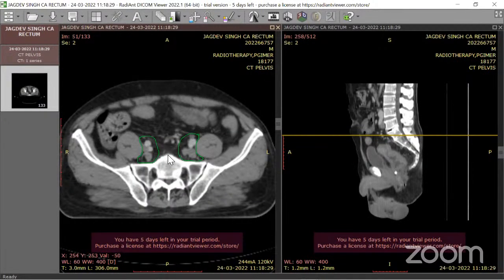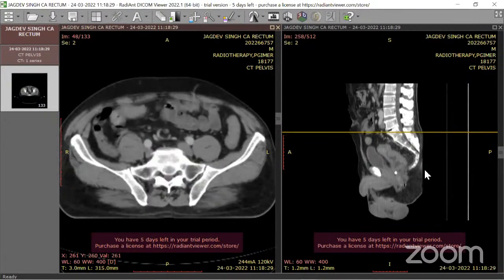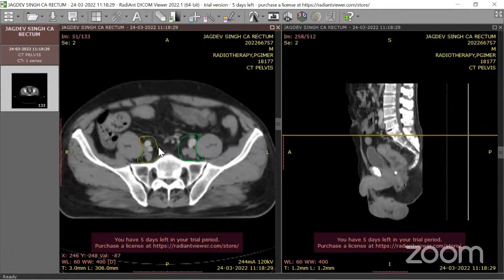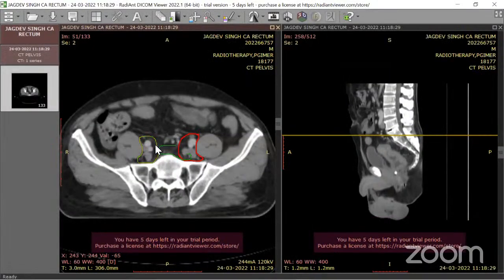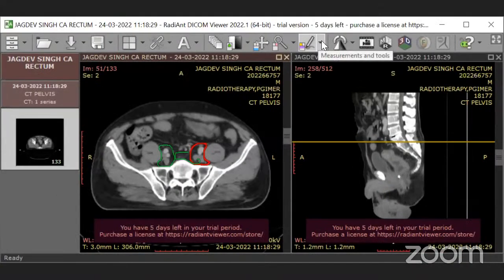Then the presacral volume, as you said, this is the S1. You start from there, and then it is contoured using a 10 mm brush. Sorry, here in this viewer, I don't have a brush, so it should be like this. So if you see the entire volume, ideally you go till, sorry, it's not working.